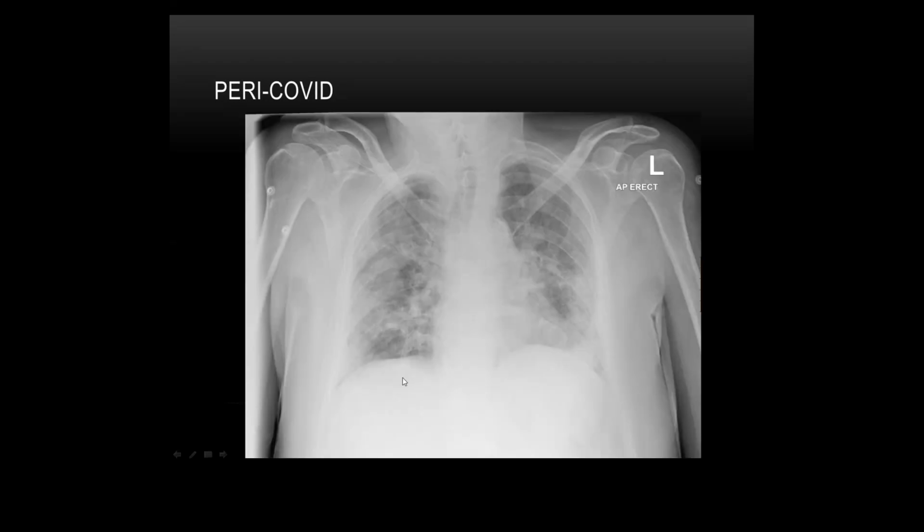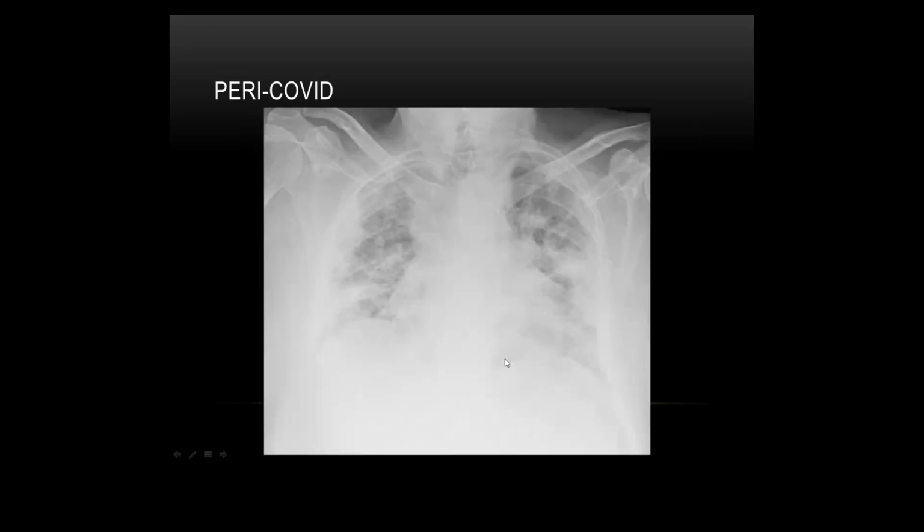They then came in, I think it was around February time, if I remember correctly. Can you see the dramatic difference in the chest X-rays? They've got this extensive, widespread consolidation with sparing, particularly this left apex, but the rest of the lungs have got some consolidation in there. No pleural effusions again. It then gets worse. Can you see how it's then progressing more to the peripheries now? It's really, really dense in these peripheries here.